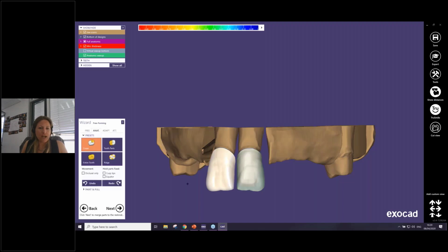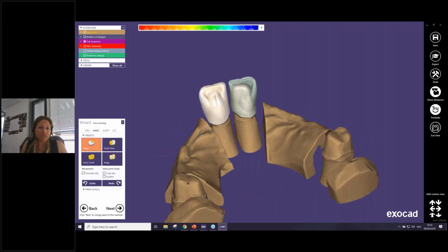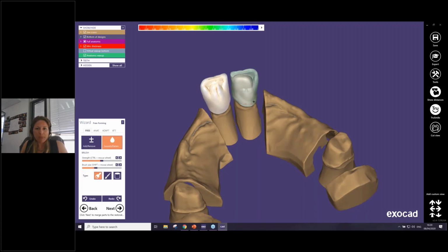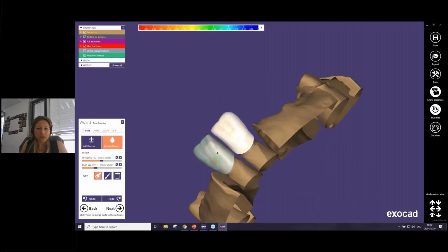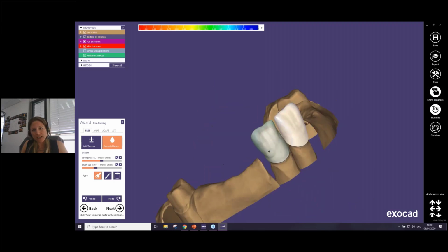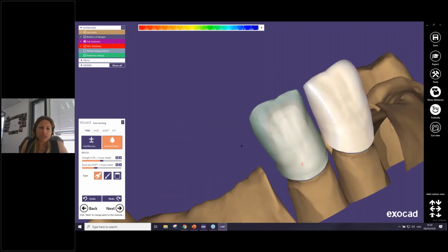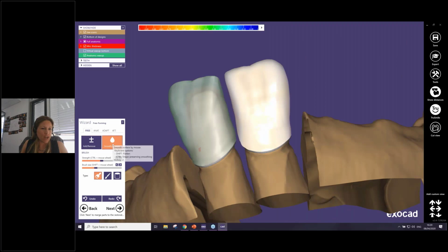And if I continue, you have once again your freeform step where you can smooth, for example, this small edge. Also over here, if you like to smooth it a little bit, you can use the normal freeform function. Also really important to know is here, we have tooltips.